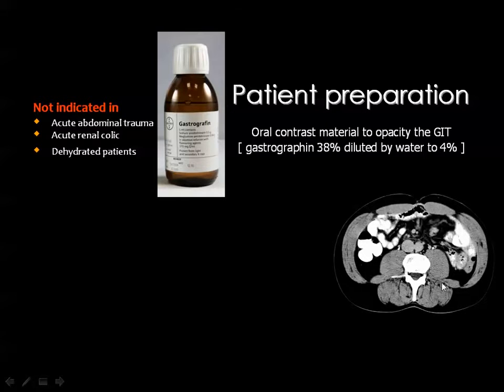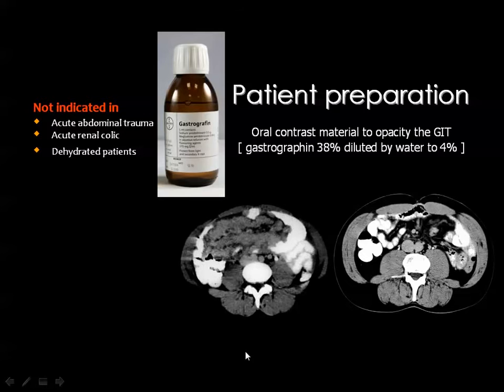So if you have a CT section in the abdomen, and you can see that the gut is filled with the orally administered contrast, and you can see orally stained loops but other non-filled loops, you know that these other loops are pathological. Then we think about the pathology according to the site of the loop and according to the clinical picture available.